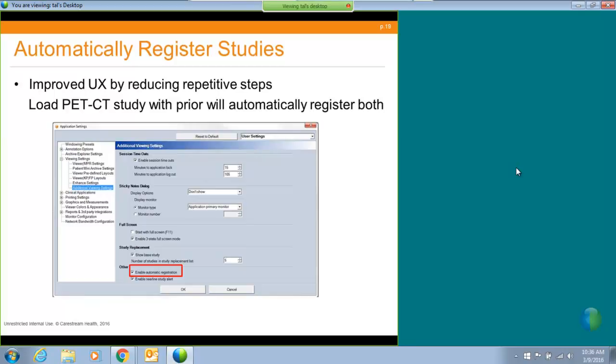You can see it here marked in red. The DP is already configured to do that. Actually, if you're at a site with DPs that were customized, be advised that this requires a CFG flag within the DP, so you'll have to toggle that on if it's a private DP. But you can look at the load PET-CT DP, it's there.